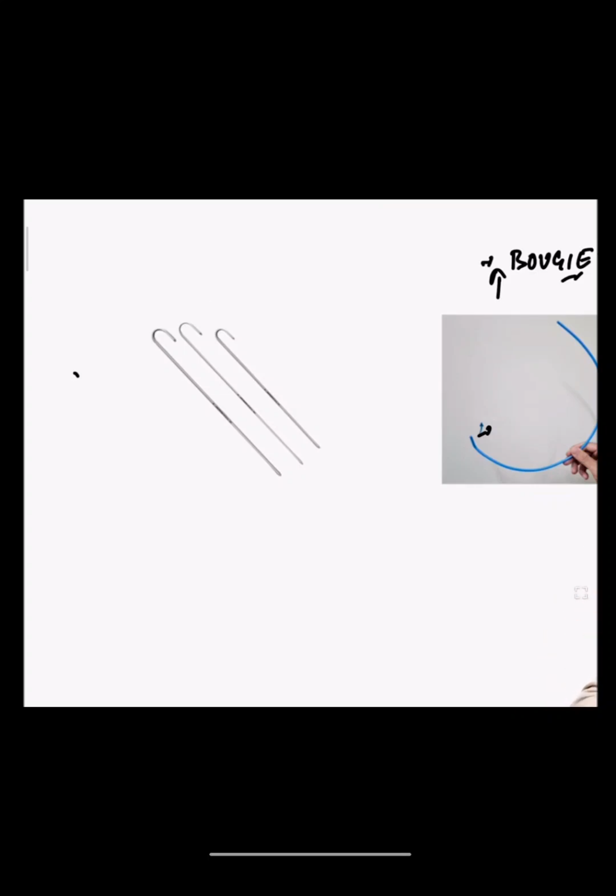This is the bougie and this is the stylet, guys. This thing is called a stylet. The stylet is basically used when you are using flexometallic tubes, and we will come to what flexometallic tubes are. So that's regarding Cormack-Lehane grading and endotracheal tube.